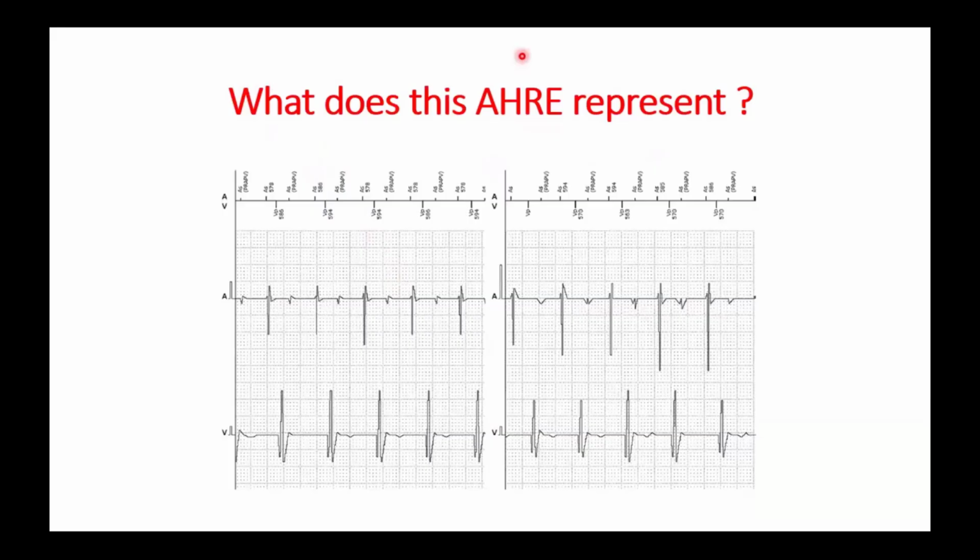This is another type of episode which is recorded. Anyone would like to volunteer and answer this interrogation? Dr. Didier, can you answer this? Didier?